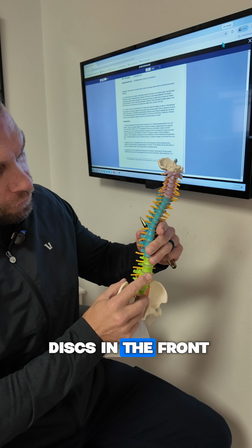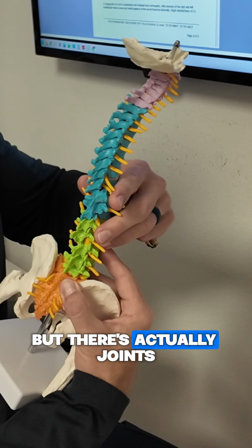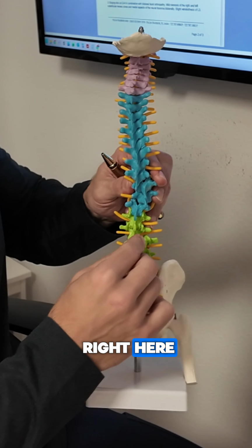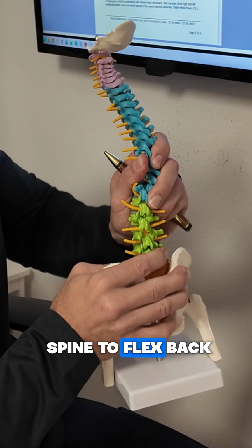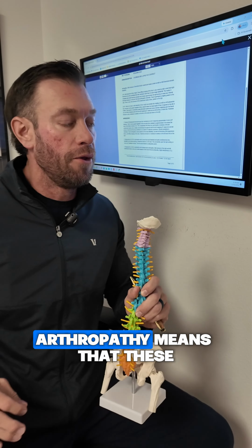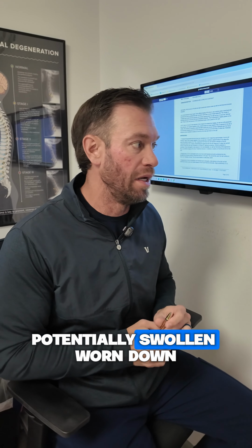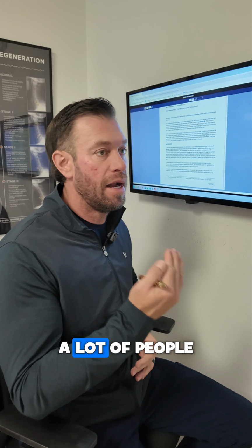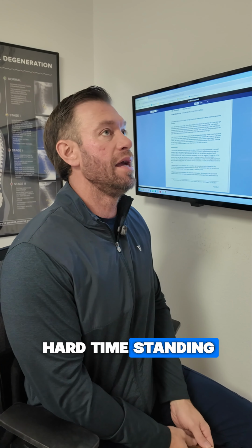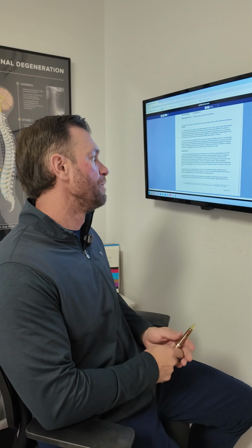You got your discs in the front. Everybody knows those. They think that that's the only joint in the spine, but there's actually joints right here and little discs in your facets, and that allows your spine to flex back and forth like this. Arthropathy means that these are inflamed, potentially swollen, worn down, some wear and tear. That's what it's describing. A lot of people, when they have a hard time standing for long periods of time, it's because they have facet arthropathy.